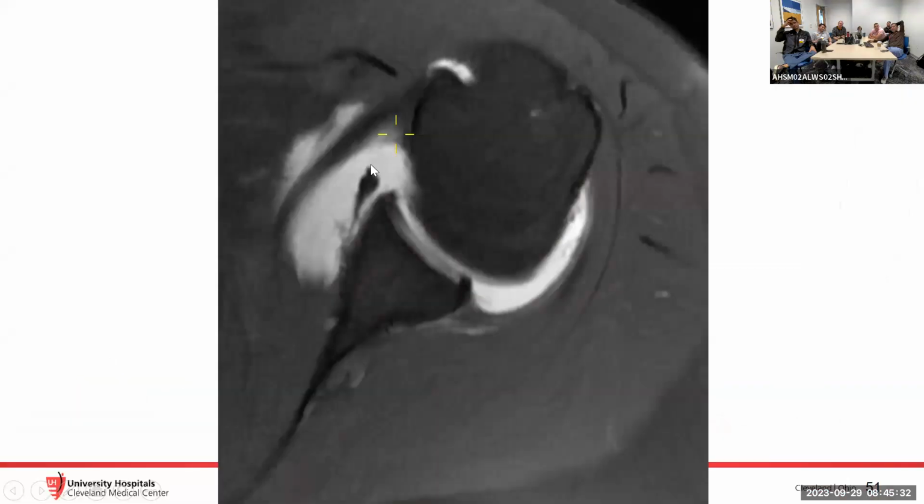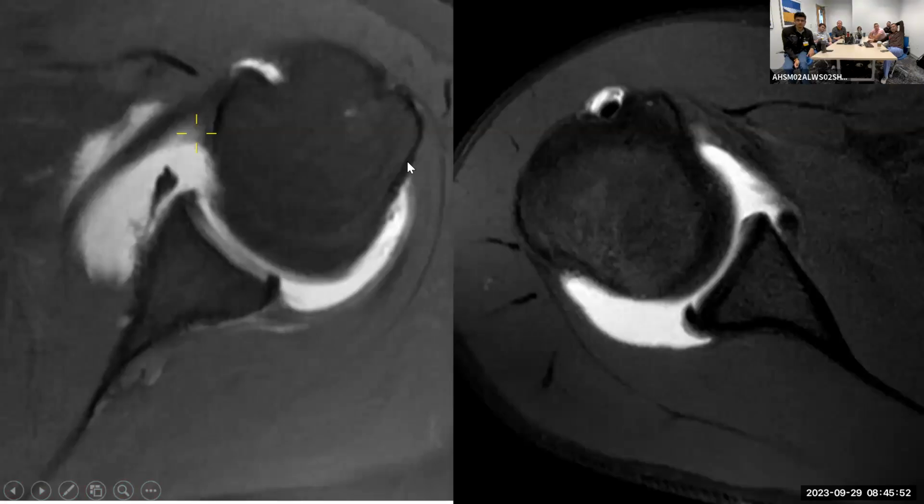This is a Perthes. We can see, in contrast to the ALPSA, the periosteum is elevated. You can see the periosteum here, but there's no medialization of the labrum. It's still in its relatively normal location, just lifted. It's not like here, which would be more indicative of an ALPSA, and this is less likely to be chronic. So just to differentiate ALPSA from Perthes.